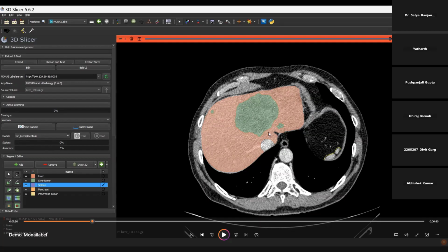So now if you want to annotate this part and it's a spleen, how do you annotate? First thing is you need to select the name of the lesion you want to annotate. Suppose I want to annotate the spleen. So I have chosen spleen over here. Then after choosing spleen, I need to choose what kind of marker points I want to use. So I have used this one, the contouring one. After choosing these two, I can just draw it over here.